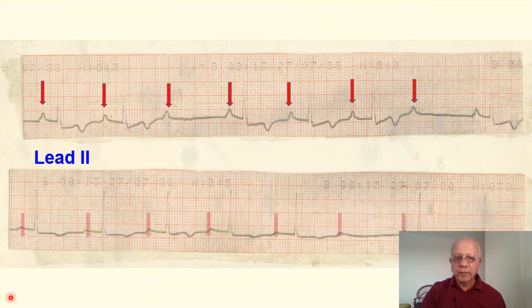Now if you look at the lower panel, again you see P waves. Now here the PR interval is short or normal, then longer, longer, still longer, and then blocked. So this block is highly variable, isn't it? The first one, this cycle, it was 3 P waves to 2 QRS complexes, or 3 to 2 conduction. Then it became a 4 to 3 conduction. Then here it became a 6 to 5 conduction. You remember that formula? It is said n is to n minus 1.